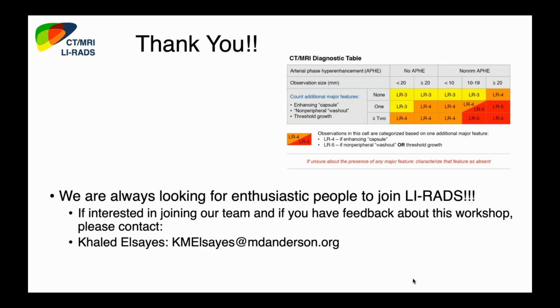This is Michelle speaking. I agree with Victoria. I've seen it a few times, and the way I like to describe it when I talk to my residents and fellows is that the central part is iso-enhancing to the background liver parenchyma on the portal venous and delayed phase, but the capsule around it is hyperenhancing. And I agree, sometimes it's almost like a Mach effect where you think that it's washing out, but it's actually the same intensity or density, whether CT or MR, as the background parenchyma at that phase of imaging. So it's still enhancing, but it's iso-enhancing and not hypo-enhancing.